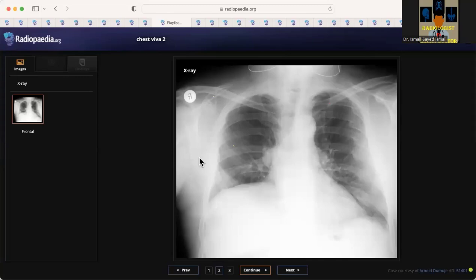I'm looking at the rest of the bones. I can see that there is diffuse increased density of the scapula on the right side. I'm not sure if it is just projectional. I'm looking from my phone, and I don't see the well-outlined scapula.